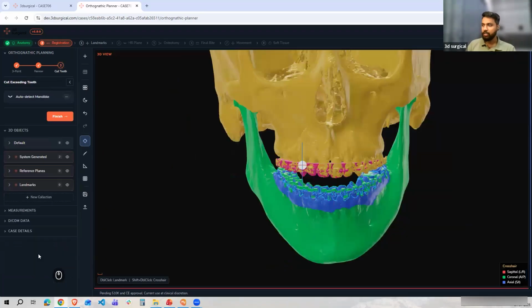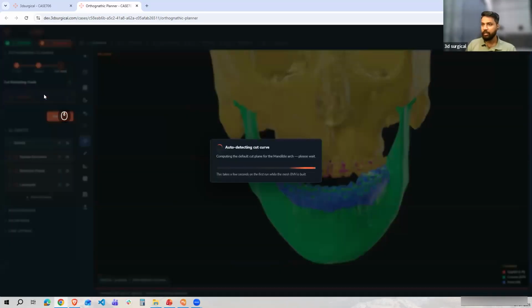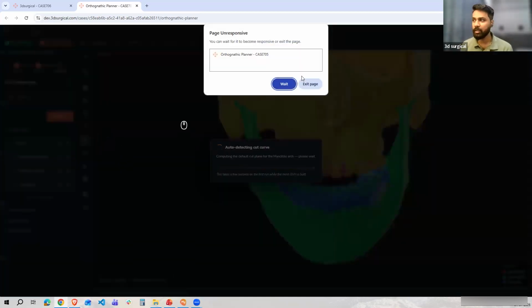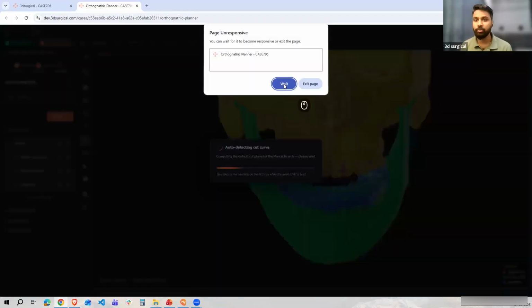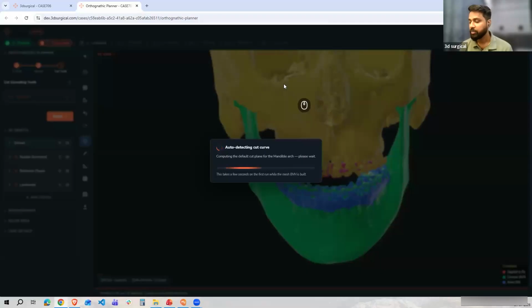Then after, I will just continue to cut, and again I will resect my mandible from the lower side. Mandible intraoral scan. So this is a registration step. Sometimes it could be possible that we are doing this registration like surface registration, then we can directly upload those registered parts, and the step can be eliminated. But yes, most of the time we don't have the registered intraoral scan. So this registration step is going to help in those conditions. So there is no further software dependency, because this tool will give you the freedom to do the registration within a cloud.